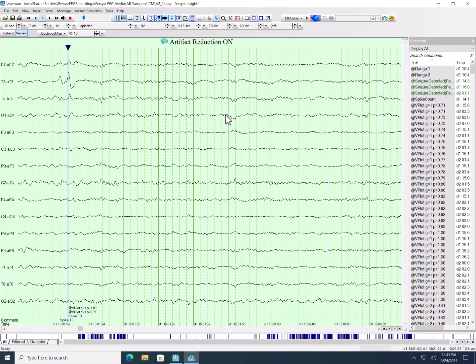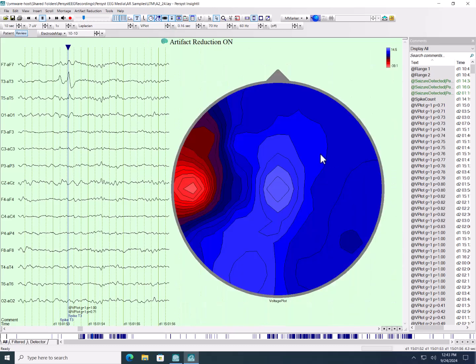So let's go ahead and do voltage mapping. Here there's a button that says NA, and there's a couple of pre-built analysis tools, so you don't have to make them yourself. And then I'll show you can customize things as well. So we're going to pick vplot. And right away it's showing me a voltage plot of this. Let's go ahead and make some changes to this.